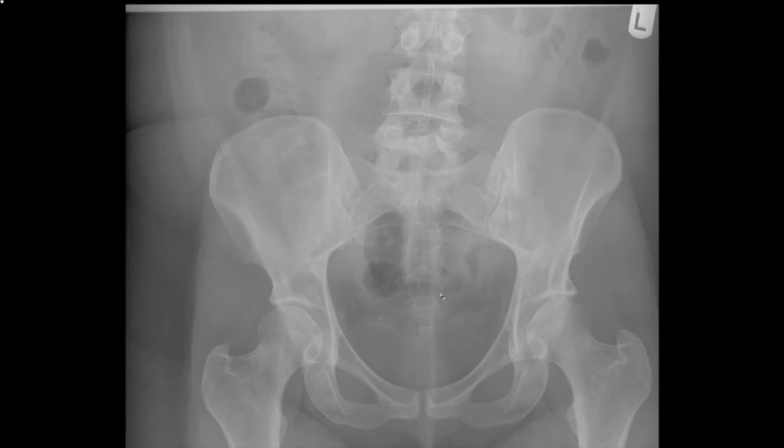The other abnormality which commonly occurs in a pelvic radiograph, particularly in patients who possibly have a fractured neck of femur, are fractures of the pubic rami. And it is well worth looking at the pubic rami carefully in such a patient when you do not see a fractured neck of femur. The pubic rami should have nice smooth cortical margins as shown here, both inferior and superior. Superior here, inferior here. Check both sides, check that there's no dislocation of the symphysis here.